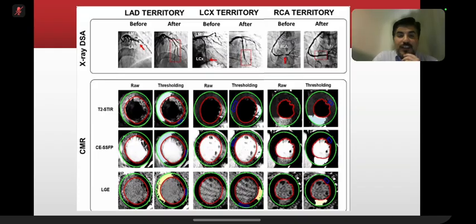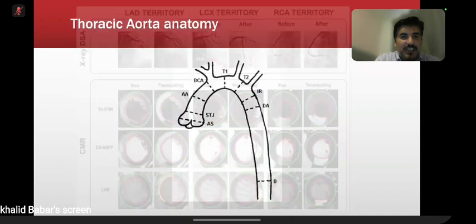Good, excellent. Candidate number 2, the other tip for your viva is to always look at the corner of the images. If you look at the corners, all these things are written there already, but I know you gave the answers out of your concept and knowledge. There are also conventional angiography images showing these different areas of narrowing. Excellent. So I think we are now ready for the cases.